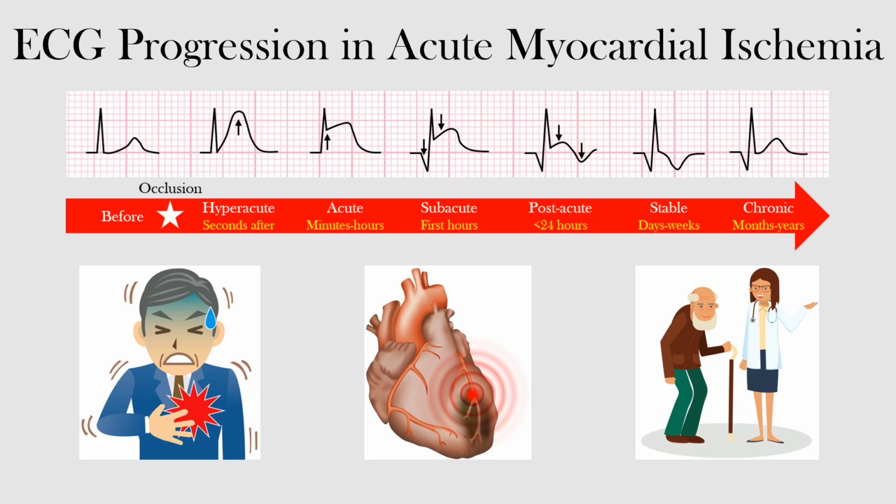Okay, so imagine that we have a 65-year-old gentleman with a history of hypertension and coronary artery disease that presents with episodic chest pain on exertion. Already, we are getting a feeling that this isn't looking great for him. But we look at his EKG and it appears normal. That is, there are no ischemic changes on the EKG.